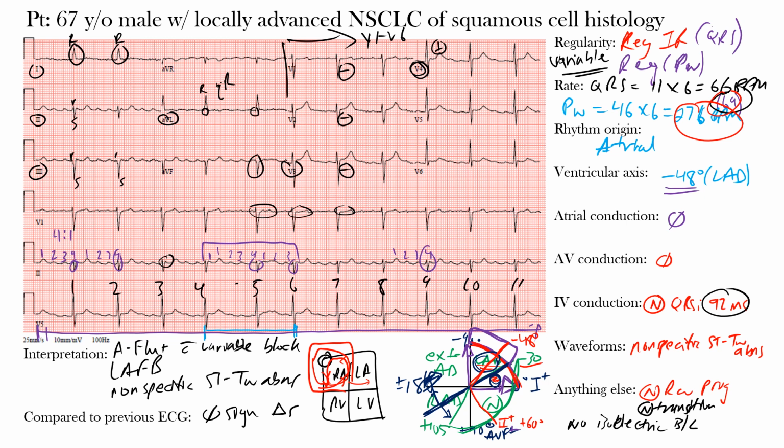Okay, so these waves here are what we call F waves or flutter waves. Okay, and these F waves have a greater duration and sometimes amplitude than the normal P waves. And it's often best to look at the inferior leads or V1 to visualize them. Sometimes you can even turn the EKG upside down to visualize them as well. Now the PR interval, we saw it tends to vary. Okay, we didn't really comment too much on this point here because it doesn't really affect our overall interpretation. The QRS interval is normal unless there's a pre-existing intraventricular conduction delay, accessory pathway, or rate-related aberrant conduction. And lastly, there doesn't tend to be any grouping or drop beats in atrial flutter.